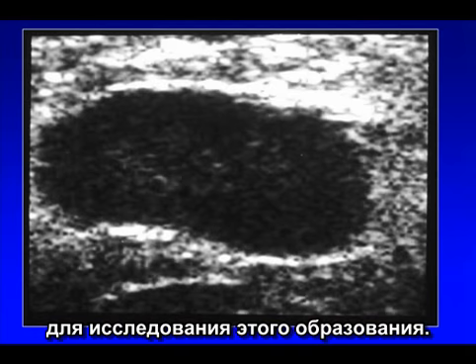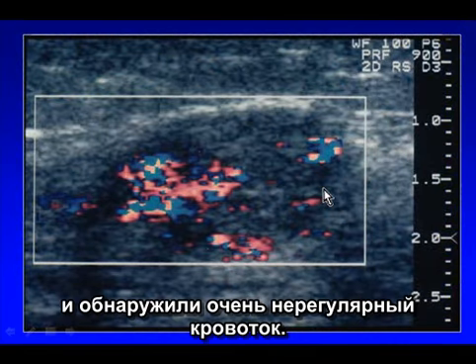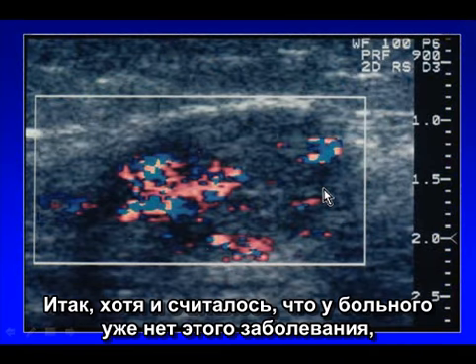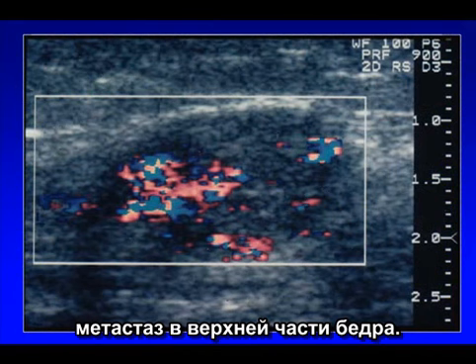Here's another non-palpable mass in this patient, higher up in the thigh. And so we then used ultrasound as a means to follow him. He was clinically free of disease when he came in a few months later, but we did a survey of the lower extremity and we found this lesion. We put the Doppler on it and it had very irregular flow. So he was thought to be free of disease at this point, but in fact had a pretty good sized metastasis in his upper thigh.